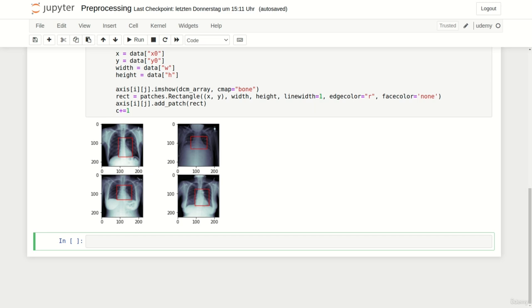As already mentioned, we use a similar routine to the one used for the classification task. However, to be able to distinguish between train and validation subjects in our dataset, we store them in 2 lists, which we save after the pre-processing is done. At first, we define our sums and sums_squared variables to compute mean and standard deviation later. Of course, we initialize them both to 0.